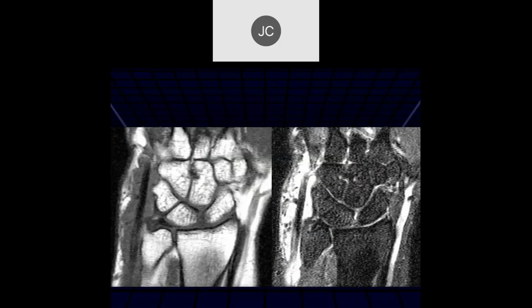Okay, Tayson. All right, so prominent fluid in the extensor carpi ulnaris sheath. The distal attachment may be a little overestimated by some volume averaging, but it looks a little attenuated at the distal attachment. Yeah, I think it's the partial voluming there getting a little out of the plane. And this is a patient who had ECU tenosynovitis.